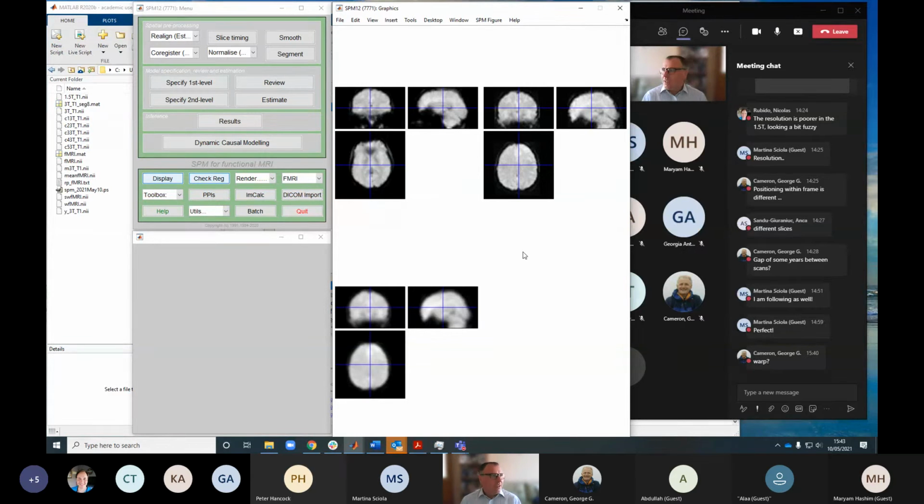So we've gone through a series of spatial pre-processing steps. These steps, in the order that I went through them, would be a standard processing pathway if you were analyzing a functional imaging data set. The bit that comes next, the model specification, is going to be very much task dependent, or dependent on the experiment that you're going to be doing.